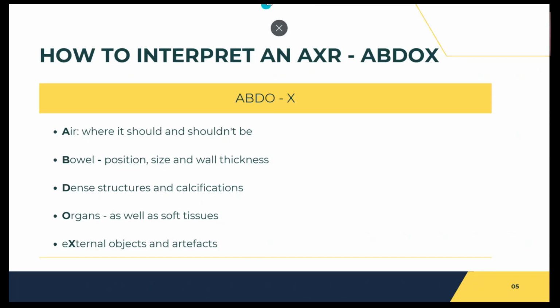And a few things I want to mention just before we begin the cases. Abdominal x-rays are used fewer and fewer nowadays because CT or ultrasound is now preferred as first line. So there are very few indications for abdominal x-ray, but it's still examined by the GMC. So we'll just go through a few cases because of this.